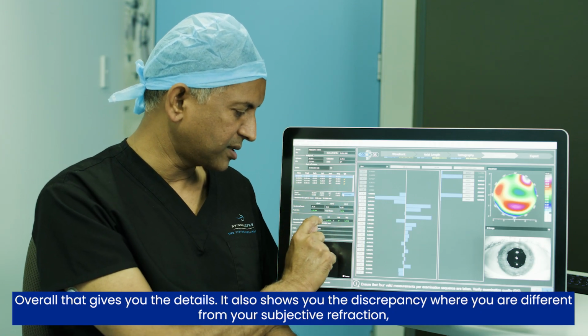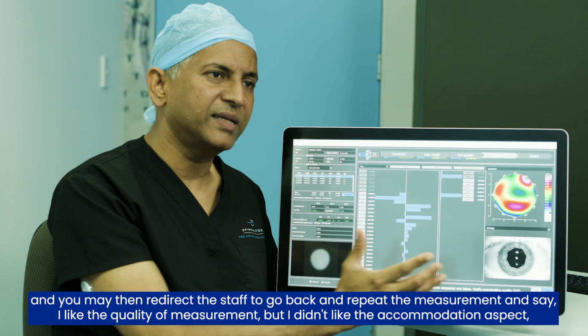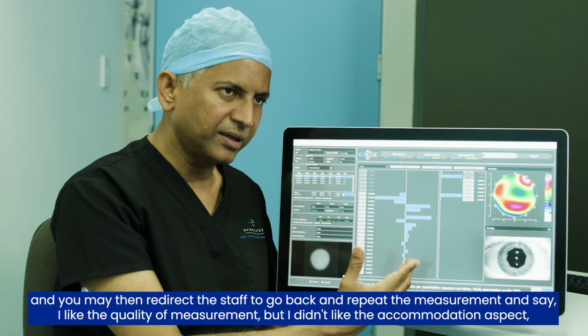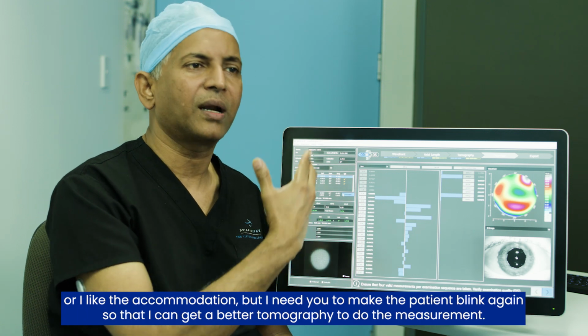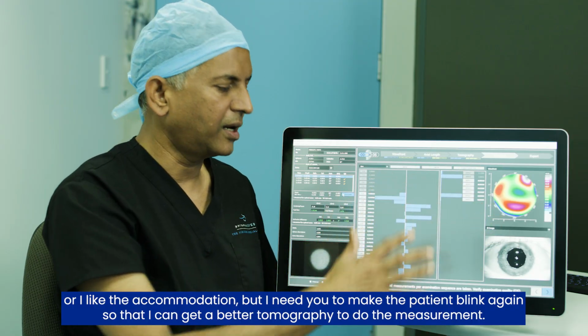It also shows you the discrepancy where you're different from your subjective refraction. And you may then redirect the staff to go back and repeat the measurement and say, I like the quality of measurement, but I didn't like the accommodation aspect. Or I like the accommodation, but I need you to make the patient blink again so that I can get a better tomography to do the measurement.